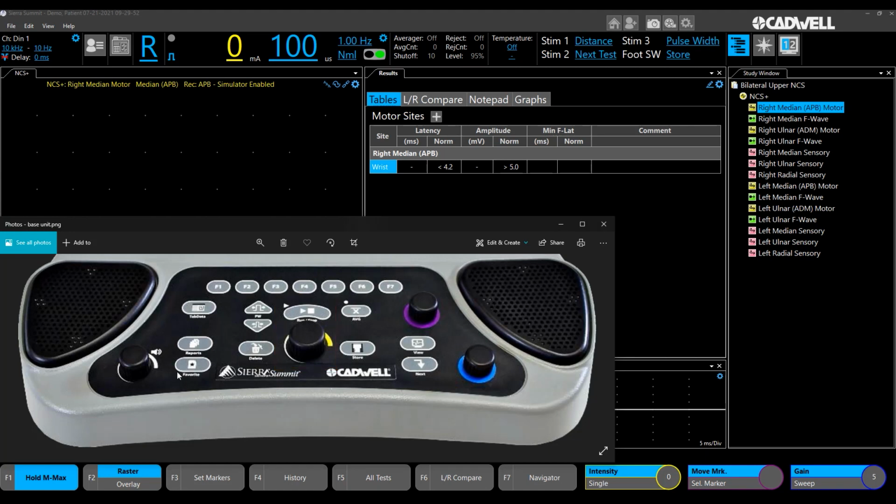The buttons on the left here, tab data, is to get into our tab data screen, which is a review of all the examinations and data that you've done. A good place to go and enter your final impressions for your report. And then this is how you actually generate a report from the hardware. You can select a report template and go to your favorite report template.